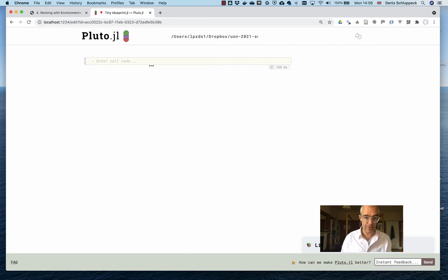And so one thing I want to do is actually use some of these libraries that we've installed. I'm going to say using Images and wait for that to execute. You can see there's like a thing on the side going on. It will tell you how long it actually took in seconds. And I can already say using ImageMagick. We also want to use that one. And the final thing we want to do is using NIfTI.